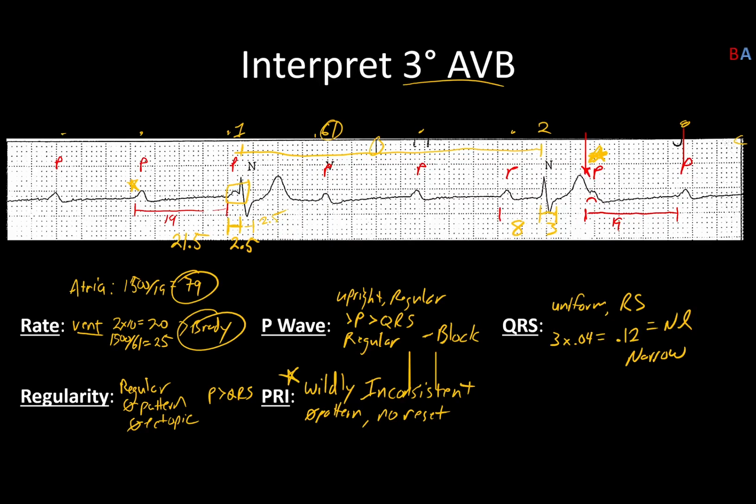So in diving deeper here as part of advanced arrhythmia, this is again the same strip that you saw with basic arrhythmia. All the markings are on there. You can take a minute to get refamiliarized. But what I'll just draw your attention to right away is that we've got a heart rate of right around 20 to 25. So we're very bradycardic, very slow.